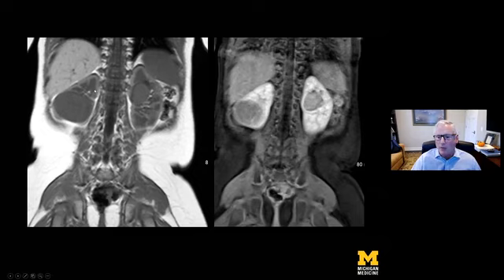Again, the marrow spaces are usually normal. Again, the important part is to make sure that you look for the multiplicity, the extent of the lesion. You're descriptive in terms of its enhancement pattern, and it enhances heterogeneously. Wilms can be quite cystic as well. And you're especially looking for that vascular invasion like I showed you.